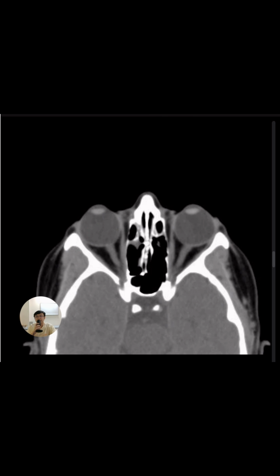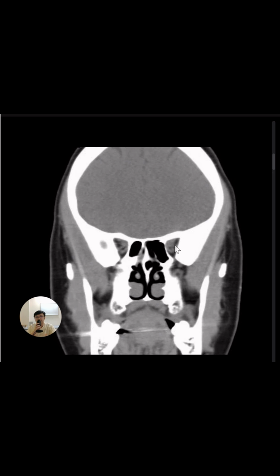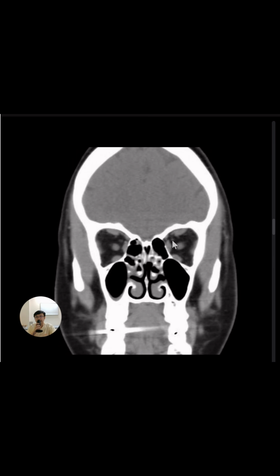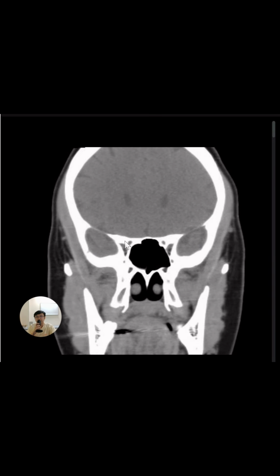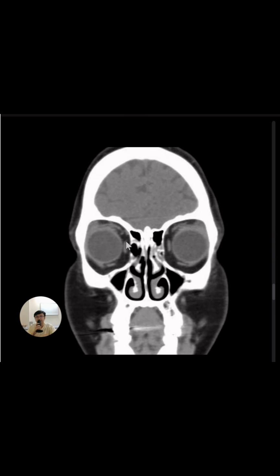Okay, and then most importantly, we always take note of the coronal plane. Try to see whether there is crowding of the orbital apex, which will compromise the visual acuity. And then also any dilated superior ophthalmic vein, which signifies some problem regarding the drainage. For example, the cavernous sinuses, okay, any thrombosis, any pathology there.